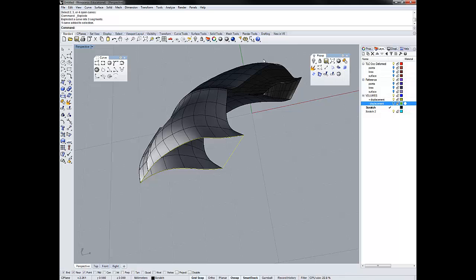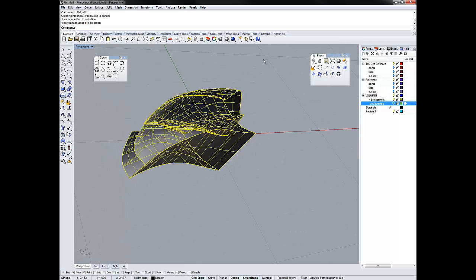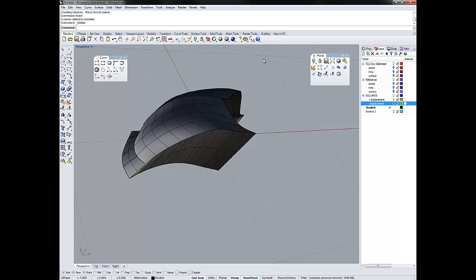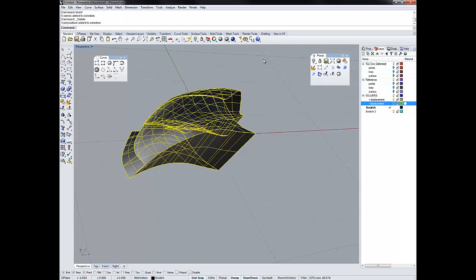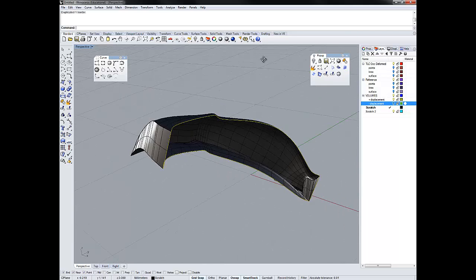And then let's select this one for our 4th. All right, and that looks like a great surface, so we're good with that. So let's select it, select this, let's type join. 2 surfaces of polysurface joined into 1 open polysurface. Invert, delete our curves, duplicate our borders, and it looks like we just have this one last border to contend with.